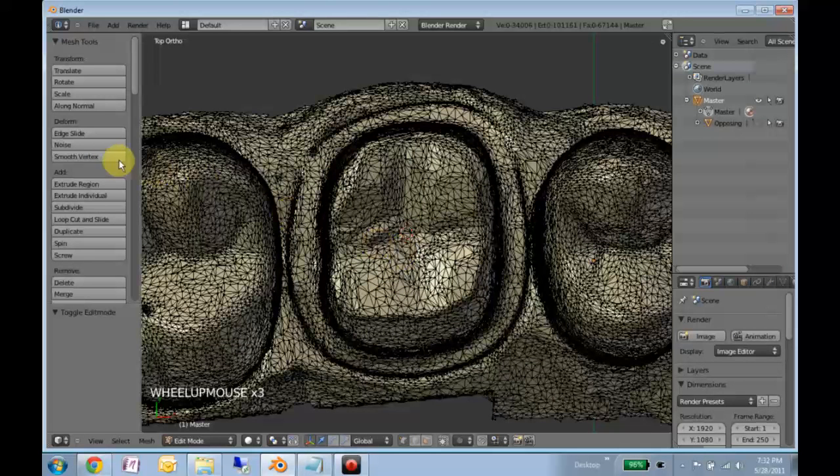Click Select Area. And these steps don't have to be in order. You can do mesio-distal prep, distal-mesio prep, or however you like it, but you want to do the prep last. So we'll hit either C to circle select. That's one way of doing it. You hit A to deselect everything. You hit B to box select.